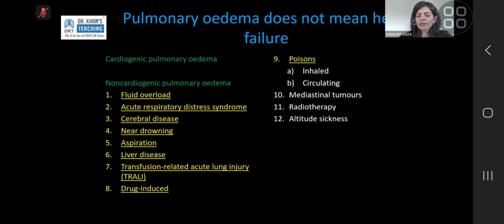You can't possibly tell why that is, especially if the heart is not enlarged. There's no sign on the history or the previous films that the patient is a known heart failure patient. Somebody going from a completely normal cardiac function to full-on cardiogenic pulmonary edema is unlikely, unless they have a superadded event that pushed them down that route.